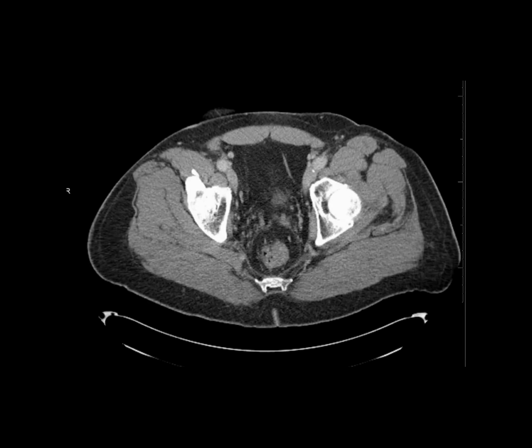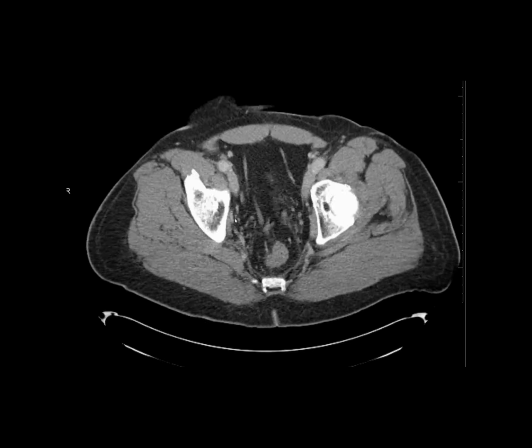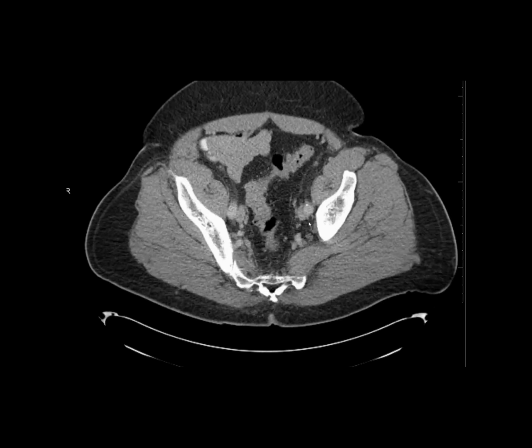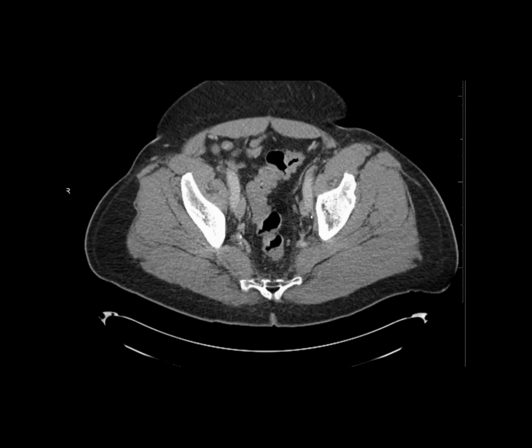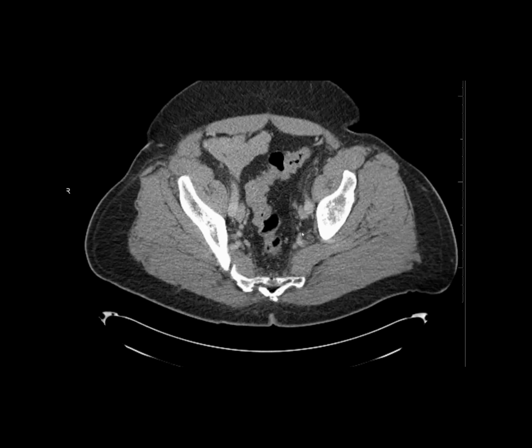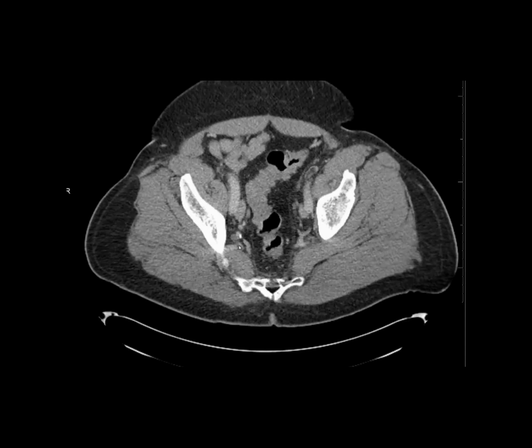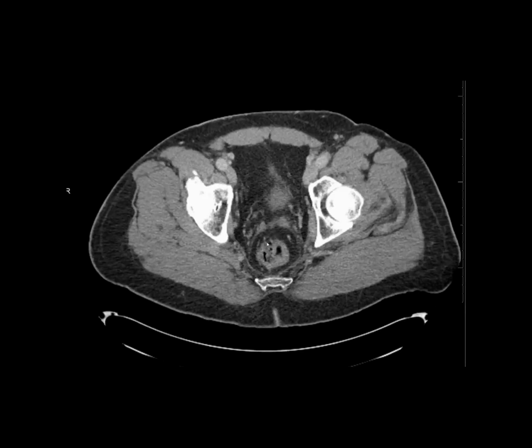This is just a small little guy that could harbor malignancy again, even though it's a small node. Then I want to look for obturator nodes, which is one right here. I'm just looking along the pelvic sidewall. Again, these ones are small. And then internal iliac and presacral. Nothing is coming out as abnormal here.